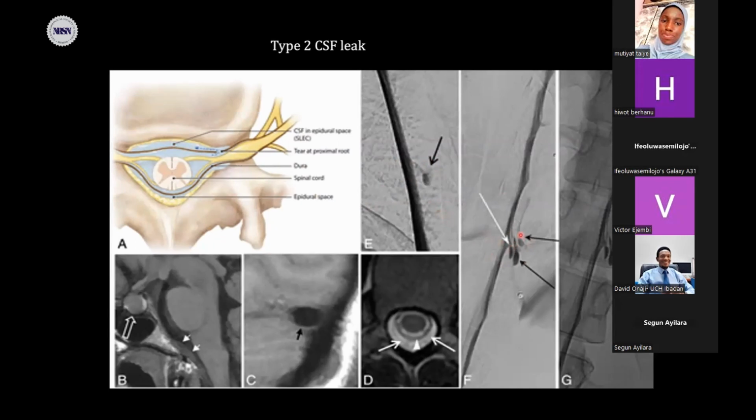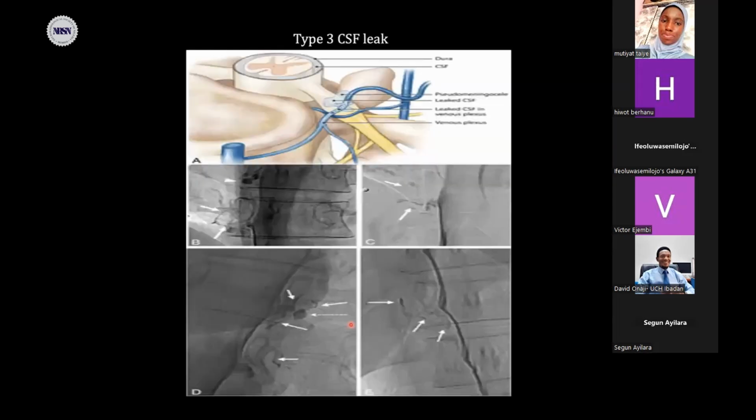So with this patient, he was placed in the decubitus position, and there was leakage of contrast through the sleeve at the thoracic segment. So this was digitally subtracted, and this is a non-subtracted digital subtraction myelogram with the features of SIH, evidence on the other pictures. We will talk about them.